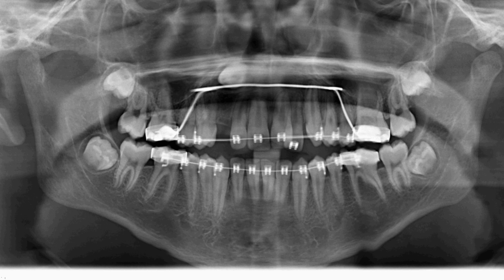First thing that you should recognize is there is an opacity almost at the level of the hard palate. And when you start counting the tooth number, you will quickly realize that this is an impacted canine. So yes, you've determined that. So here we have an impacted canine.